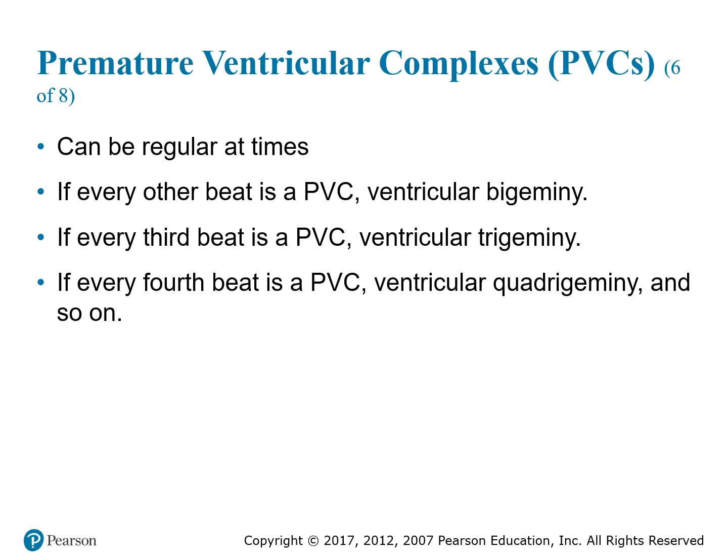Sometimes it'll be every third beat that a PVC appears. We usually call that a ventricular trigeminy. And sometimes you get a regular beat, a regular beat, a regular beat, then the fourth beat is your PVC. That is usually called a ventricular quadrigeminy, and so on and so forth. If we start to see quadrigeminies, that means too many PVCs are coming through.